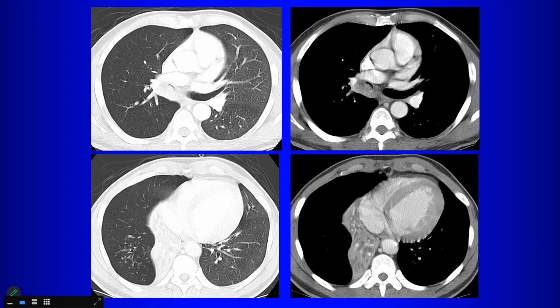Okay, so let's go through the differential of endobronchial lesion. Do you like carcinoid, yes or no? I mean, it's not common. So, yeah, carcinoid though does belong in your differential for an endobronchial lesion. But what's a typical feature of carcinoid that this does not seem to demonstrate? Right. Carcinoid tends to be a very vascular tumor with marked enhancement, right? So you would like to see that. We don't have that here, but still going to include it in your differential, right? Carcinoid tumor, maybe the patient didn't read the book.